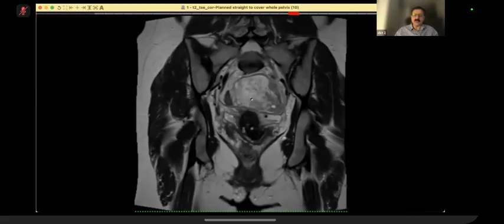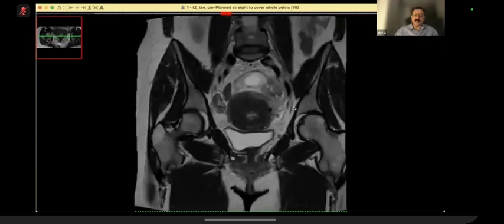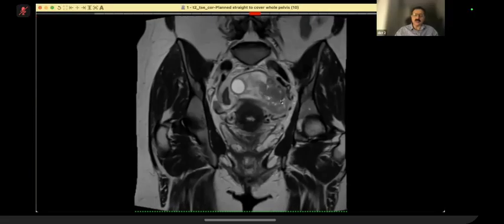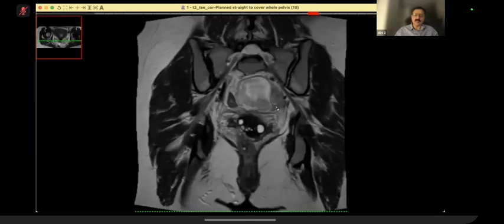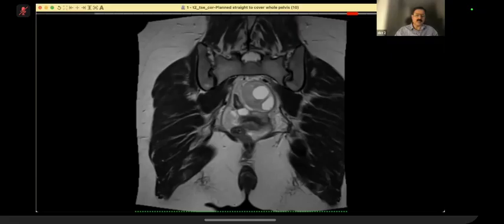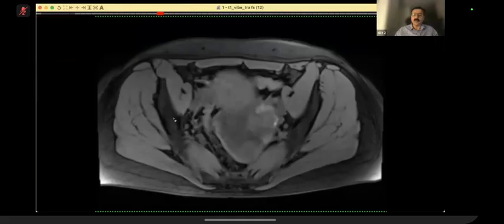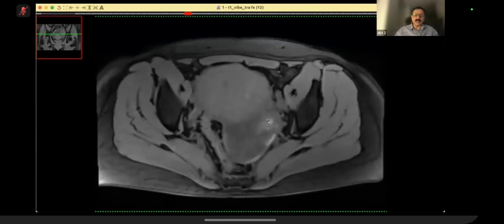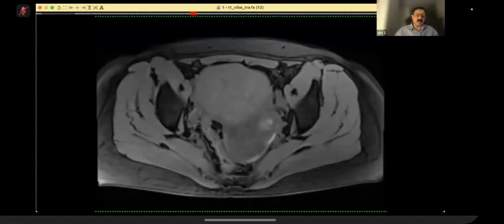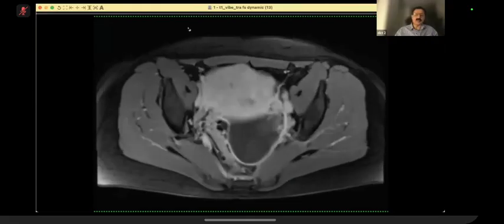And this edema, you have to develop your eyes for this edema. And there is some peripheral cyst. The sagittal actually showed you the twist much better than any other sequence, but you can see that twist here also. Pathognomonic with contrast, it does not enhance. Oh, by the way, I forgot that there can be hemorrhage inside. In this case, there was hemorrhage, which is present here, but that is part of the pathology. And on post-contrast, it will not enhance.